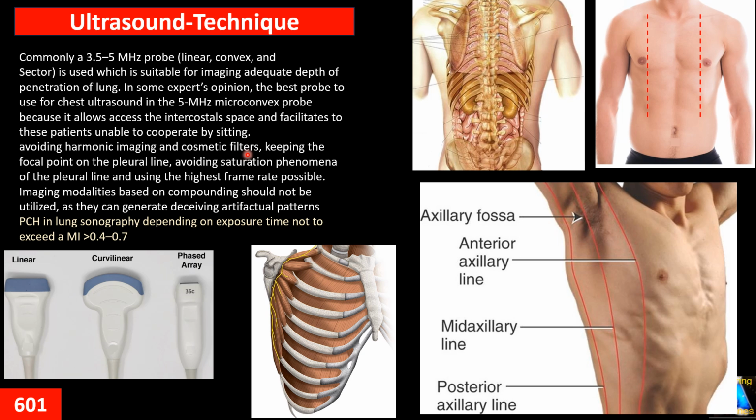We select the setup for scanning the lung, or if we don't have it, we can do many important image optimizations. First of all, we have to turn the harmonic off. We make compounding zero, and all those other features that make our image clean and smoother, we have to turn down or eliminate for scanning the lung, because we want the highest resolution for the artifacts.